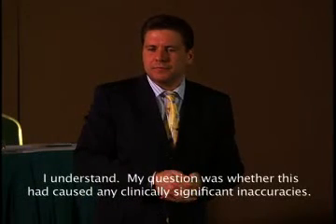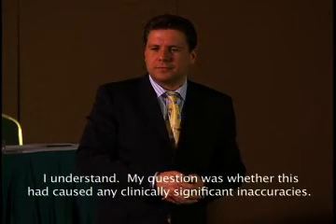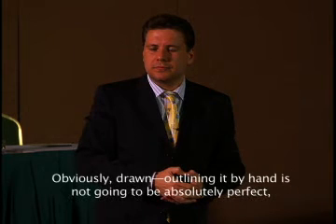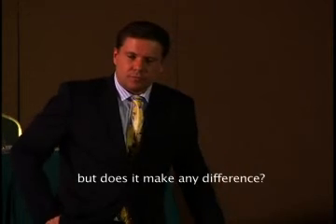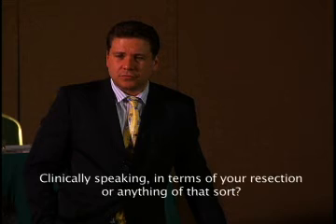I understand. My question was whether this had caused any clinically significant inaccuracies. Obviously, outlining it by hand is not going to be absolutely perfect, but does it make any difference? Clinically speaking, in terms of your resection or anything of that sort? As you saw here, our overall experience is if you have the structures segmented and you've gone virtually, you were flying into the structures and they were there, you have a feeling, you have a certain déjà vu effect, you have an increased confidence when operating.